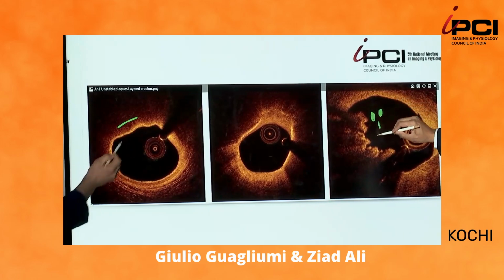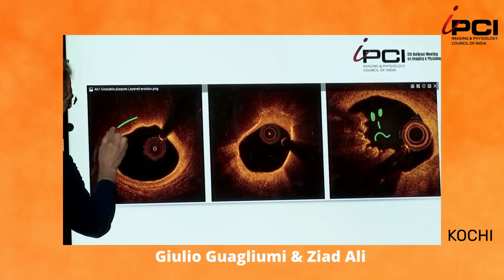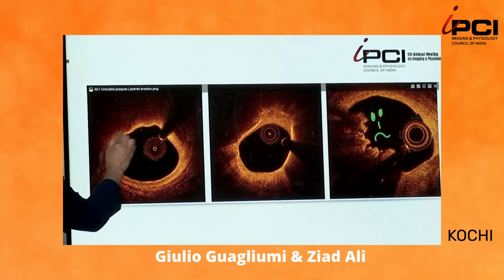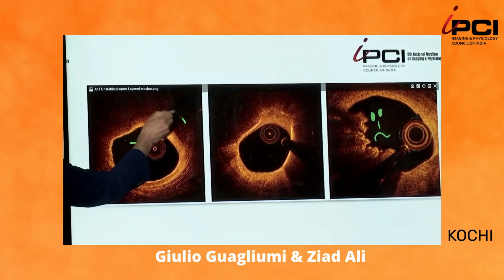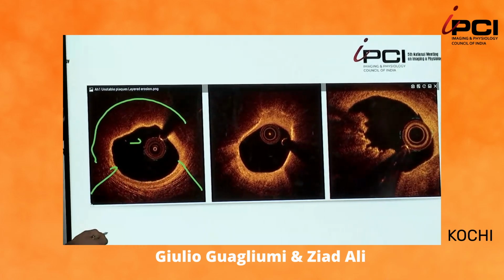What is this one? Okay, thick cap. Okay, thin fibrous cap atheroma. You cannot see the EEL behind. You can see the EEL from here to here. What about this one?